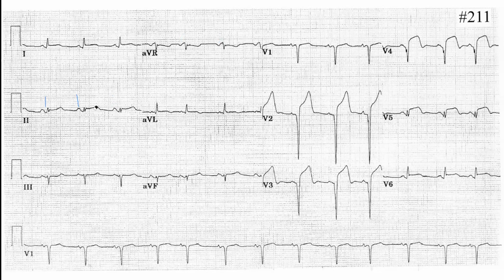Morphology of the P is fine. PR interval is normal, very good. QRS, is it wide? I think it's narrow enough. It's narrow, okay, good.